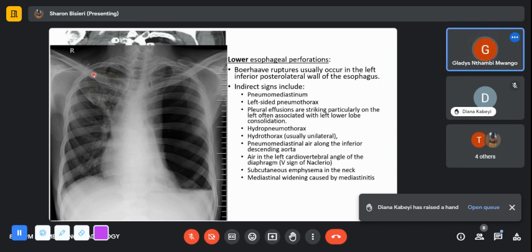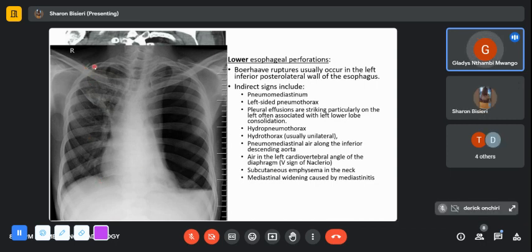But are there opacified lung markings beyond it? Well, I don't quite see them. What I'm thinking more is you can see it's opacified, there are air bronchograms, and it's limited by the horizontal fissure, which is elevated.